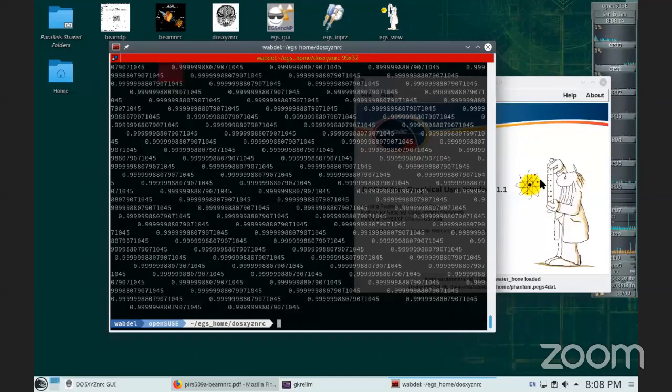But there is an application called MMCTP. That's the McGill Monte Carlo Treatment Planning system, and basically the idea is you get your phantom, and you have your Monte Carlo somewhere on a computer.